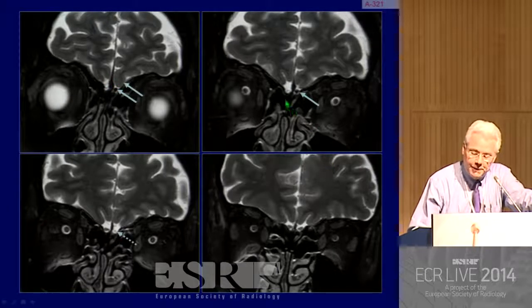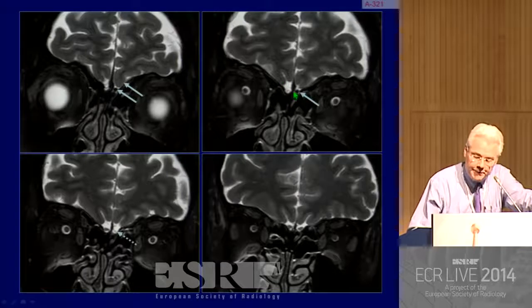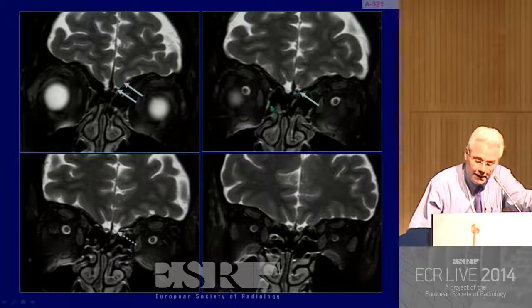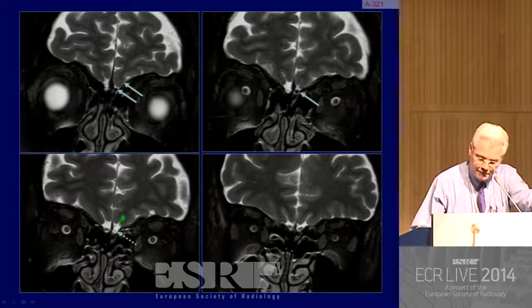A little bit backwards, you see that the olfactory bulb is appearing, which is not a surprise. But on the other side, you have a black, unidentified object. What is it? We step again a little bit backwards, and we see that the black object disappears, and we see the appearance of a normal sulcus and the beginning of the bulb.